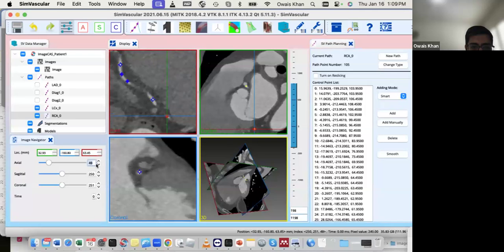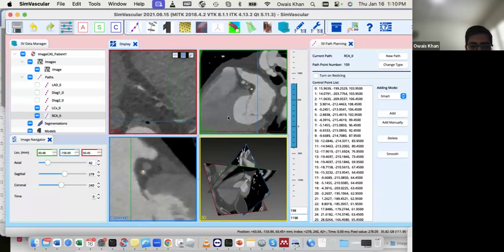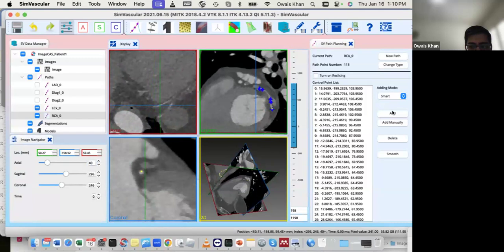And I don't really care about all of the branches because I'm going to take care of them at the end. First, I need the main branch, main trunk, and then I'm gonna figure out all of the sub branches. So it's getting pretty small.